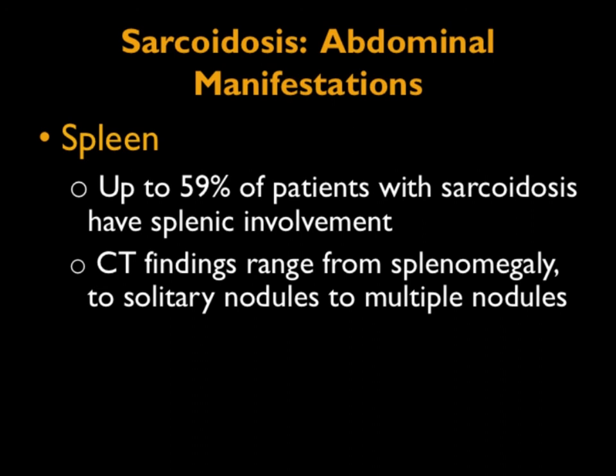So just remember that. Now, again, one of the things I've noticed is often the diagnosis is a total surprise. Right? No one expects a diagnosis of sarcoid. Patient gets a CT for some reason, and all of a sudden everyone's worrying about malignancy. So always think about sarcoid, particularly in healthier young females.